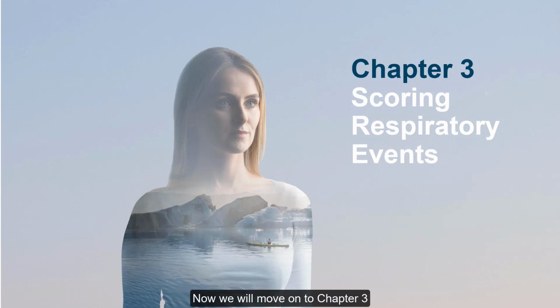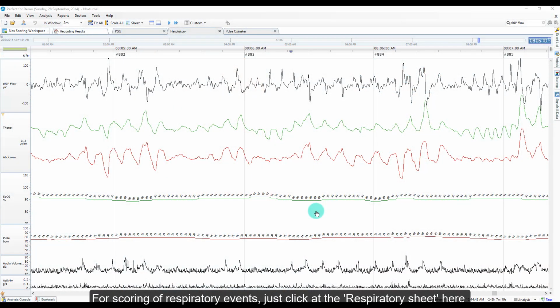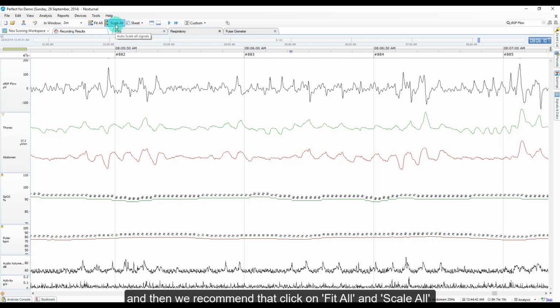Now we will move on to chapter 3 on scoring respiratory events. For scoring of respiratory events, just click at the respiratory sheet here, and then we recommend that you click on Fit All and Scale All. This eliminates the hassle of adjusting the signals and windows manually. It is so convenient and fast when you're scoring the respiratory events via Noxturnal software.